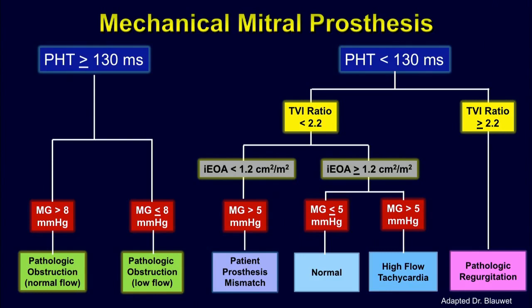Thrombus may be mobile, but it's usually the timing, where there's more of an acute change in clinical symptoms, that helps us to determine whether it's thrombus or pannus. I don't know, Roberto or Marty or Jerry, if you have any other thoughts. No.